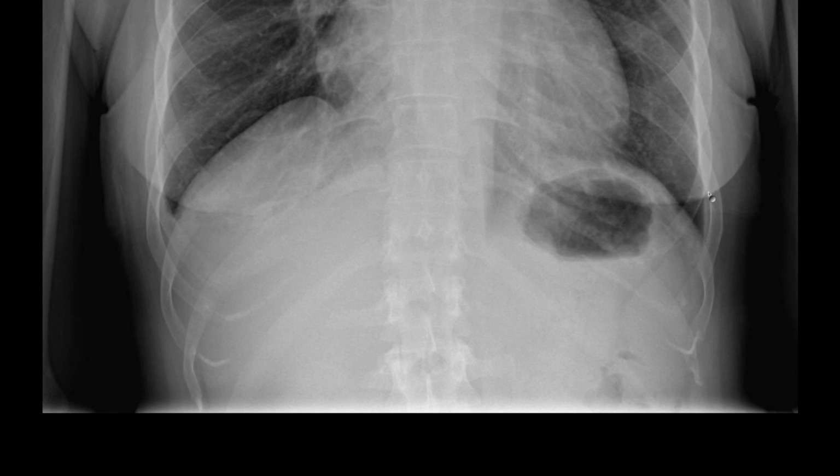Now, there are also findings that go along with hypervolemic interstitial lung edema, including a change in the size of the cardiac chambers, a distended azygous vein, and so on. But what I want to show you here is something I've not encountered as a term in the United States, but they do use it at least in England. This is really subtle, but I look for this, so I always wanted to try and find a case. So there is opacity, but it's not right in the posterior costophrenic sulcus, it's just above. And maybe there's one like that on the other side.